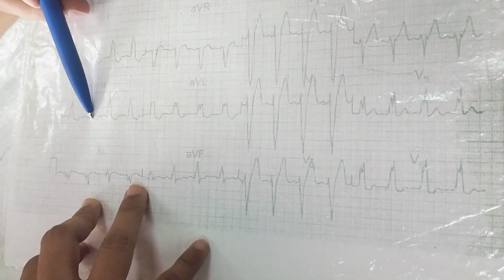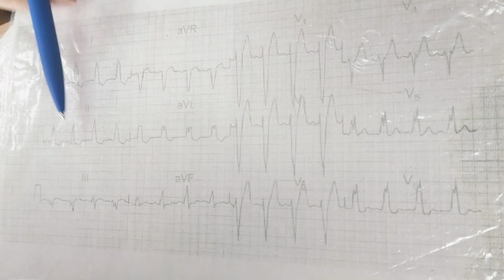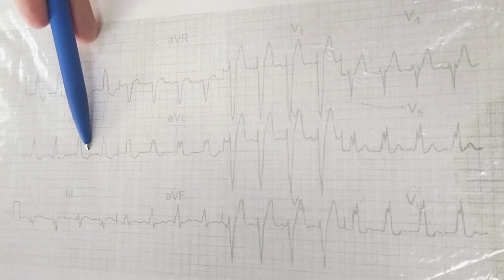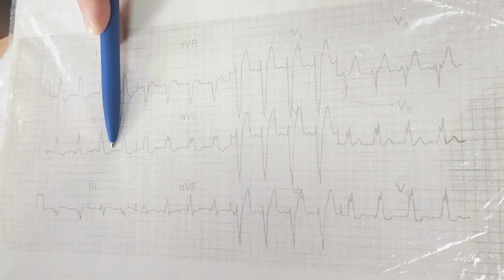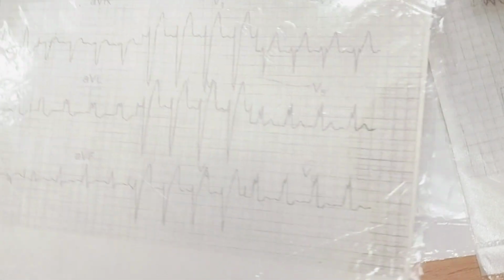It is QRS complex, ST segment, T, P. Okay. And there is also tachycardia. Sinus one because the P wave is here. So sinus tachycardia plus wide deformed complexes.